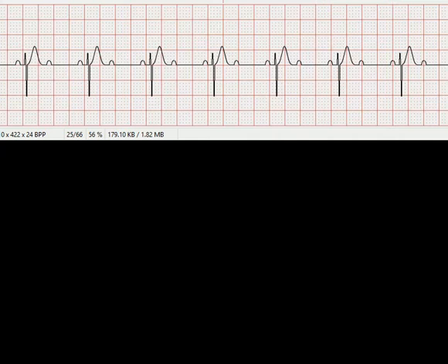So if you look at this one, QRSs are narrow again. P waves, round, upright, symmetric. PR ratio, if you look at this, this is actually a 2-to-1. I've got more P waves than QRSs, though. That's the most important piece. How about PR interval? Is it consistent? Yep, every time I have a PR interval here, it's the same. So I have a consistent PR interval with more P waves than QRSs. We've already got the makings here of a classic heart block, second degree type 2.